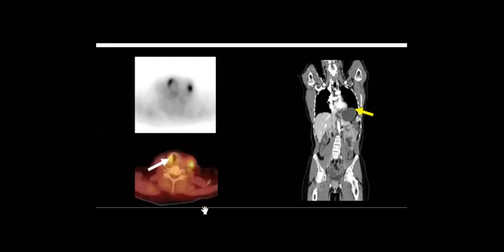Okay, so do you remember when someone asked me about the vocal cord in the previous case? It was having a high uptake, right? And I told him that sometimes if the patient just talks, he will have this high uptake. So when you lose the uptake on the left side, this means that the normal uptake is absent.